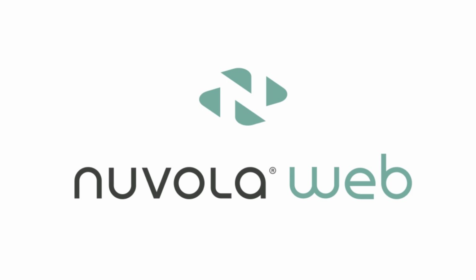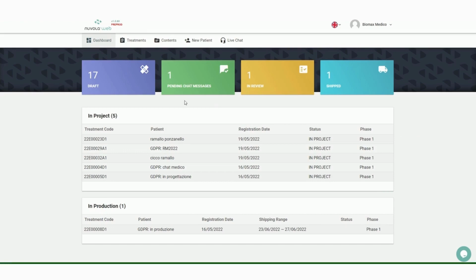Welcome to the Nuvola Web platform dedicated to the clinician. This is the dashboard that gives access to treatment requests to be completed, cases with a pending chat, cases in review, and cases that have been shipped. Below are cases in project and cases in production.